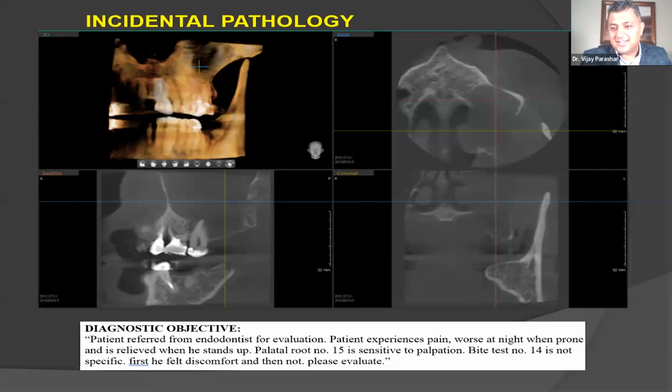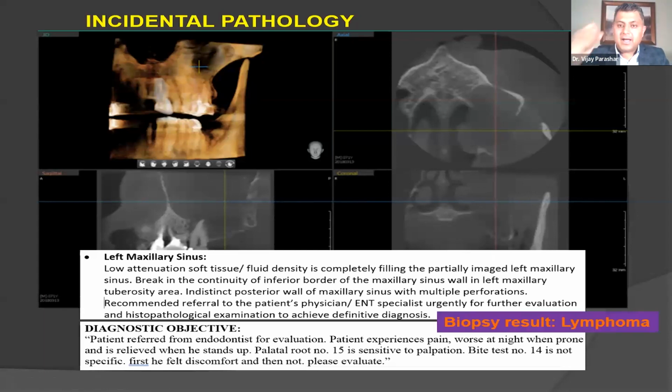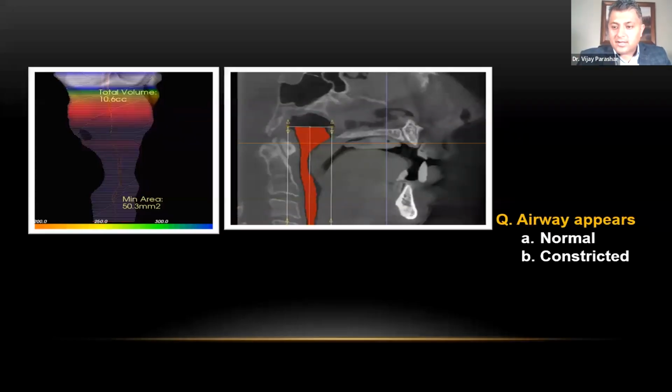You guys are amazing. Okay, so yes, you're all observing that the posterior wall is not there. So this does not look good. Again, it should be identified. This was the description, all the changes that we have discussed so far. This is the way I wrote it, and the biopsy came back as a lymphoma. Okay, let's take a look at a couple more images.